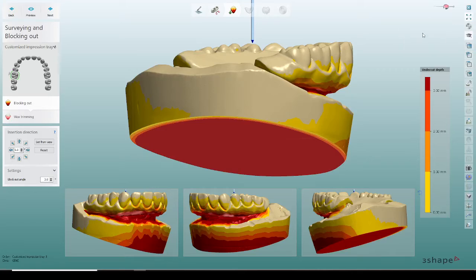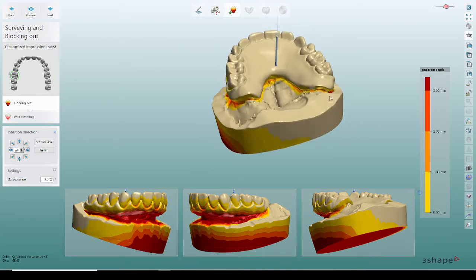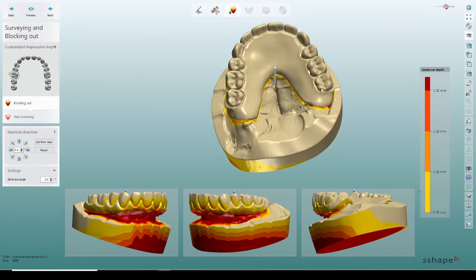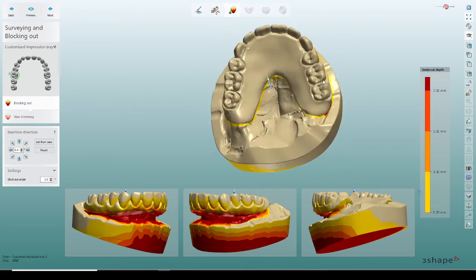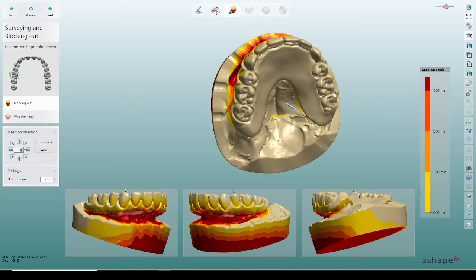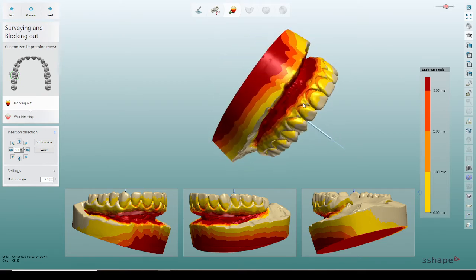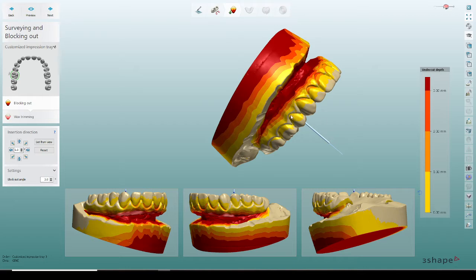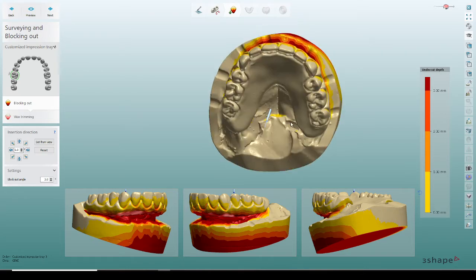Hi friends, so a buddy of mine asked me to show how I design these cages that I use for designing bars and for scanning and for resetting teeth back onto the model. So the first thing I do once I have my wax up, this particular wax up is actually on locators, but you can't see right there. So once it's on locators, I'll snap it back onto the model.